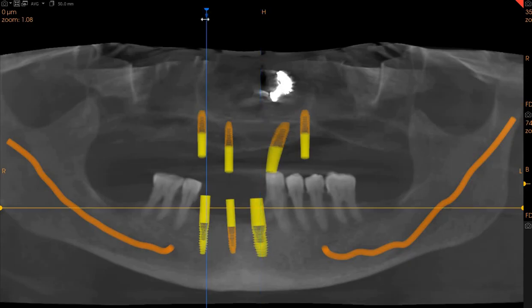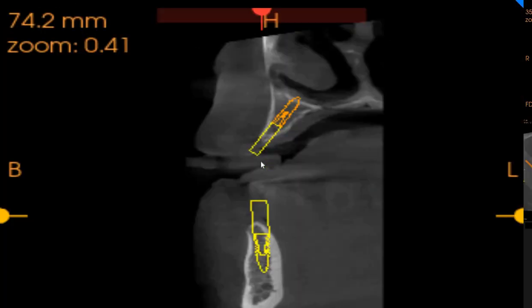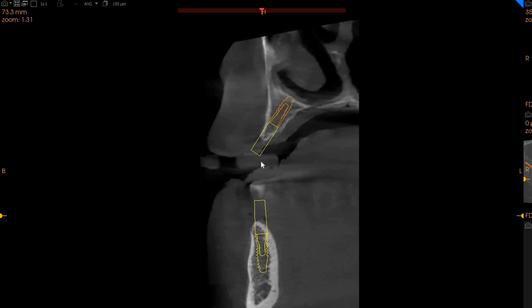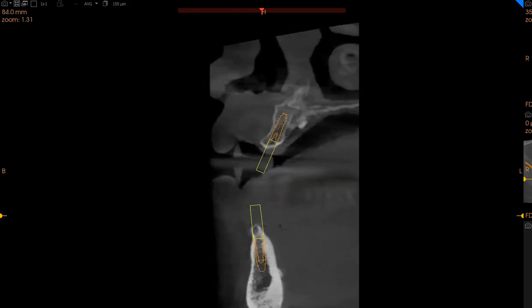Starting with the upper right posterior most implant, as you can very clearly see here, this is a deeply placed implant. We have to go approximately 5 millimeters deep, or 5 millimeters of alveoloplasty will need to be done in order to place an implant, because we just have 5 millimeters of ridge width with 10 millimeters of height. Moving to the upper right lateral canine region implant.